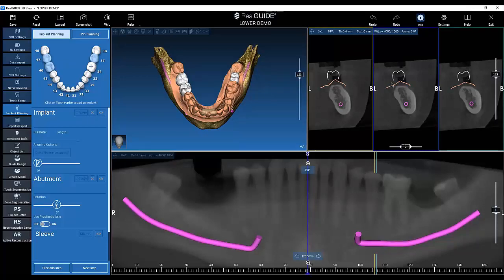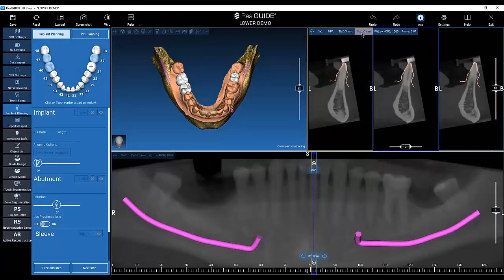This window shows the cross section. You can see as many cross sections as you want by clicking on this icon. So you can see 1 or 3 or 5. In this specific view, in this specific layout, I can see three cross sections which are spaced 1 millimeter between them. So 1 millimeter distance from this to this and 1 millimeter distance from this to this.